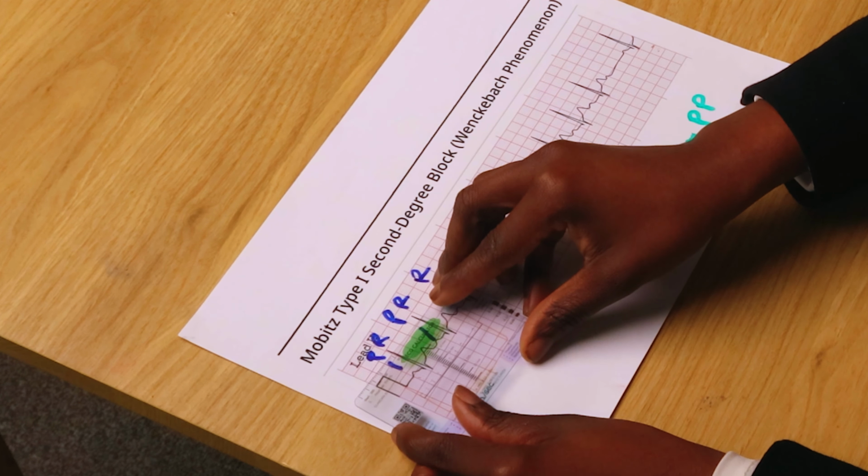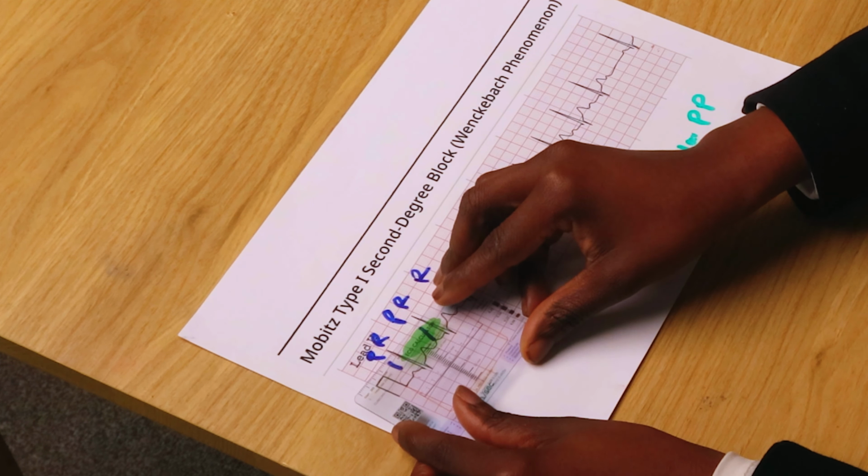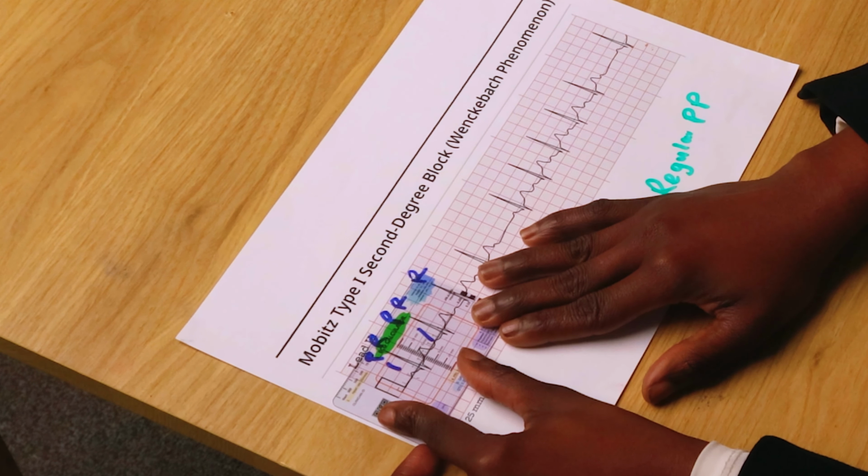Now I'm going to use my ECG ruler here. Some people use ECG rulers, some use calipers, and some just count the small squares to calculate their PR interval. And you should already know that your PR interval should not be more than 5 small boxes. Whenever you see a PR interval that is more than 5 small boxes, that's a giveaway for you. It is a block going on there. And then the next thing would be to find out what block it is. Moving on from that, I'm just going to calculate my PR interval using this ruler. When I check the first complex I have here, I find that my PR interval is about 6 small boxes. There's a block.